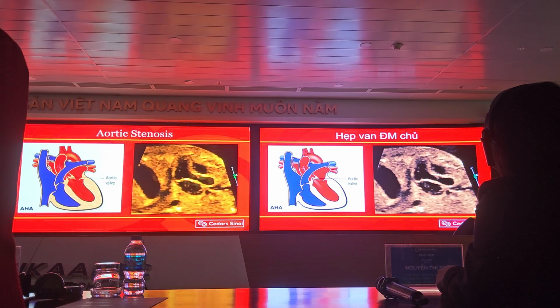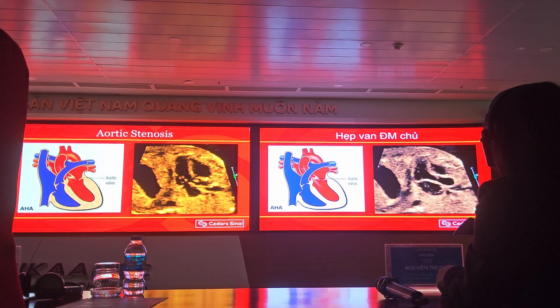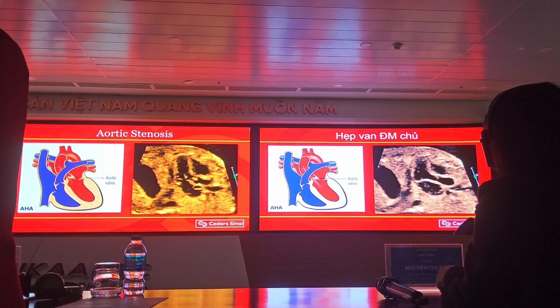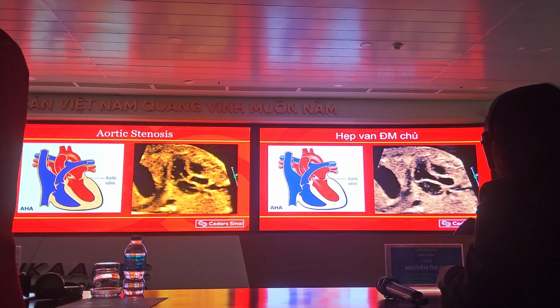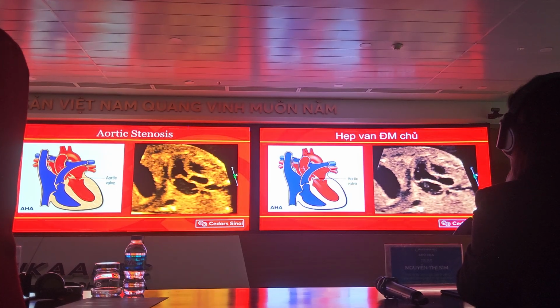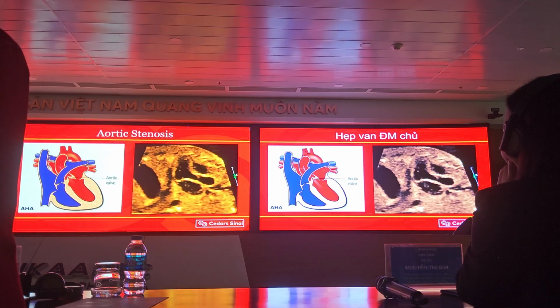But it all starts with identifying the aortic valve abnormality. In the case I showed you this morning that was missed, the aortic valve was not very well seen. We saw the left ventricular outflow tract, but the image was not optimized. The angle wasn't appropriate, and you could barely see the aortic valve. It wasn't zoomed up. So always look at the aortic valve in every single fetus, including screening as well as fetal echo. Look at the aortic valve very carefully and the pulmonary valve very carefully, just like you look at the mitral and tricuspid valve.